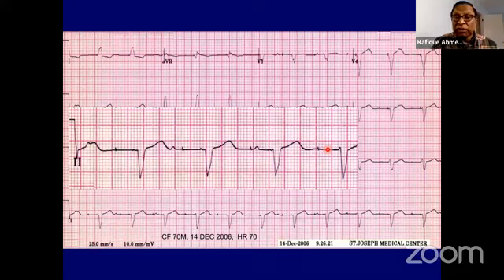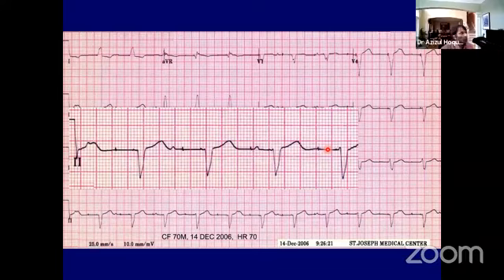Any questions from anybody? One question I have: if the P wave, like we call a blocked P wave, comes just immediately after the V complex, that might fall into the blanking period, right? And the atrium might not sense that.